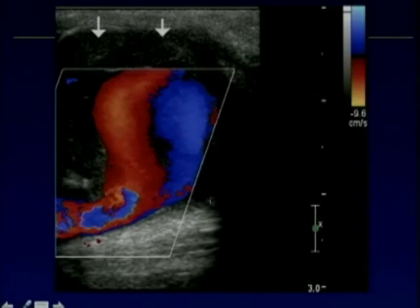But when you have something that is a pseudoaneurysm, be sure to not just describe the dimensions of that pseudoaneurysm as within the patent portion, but describe and measure the entire mass.